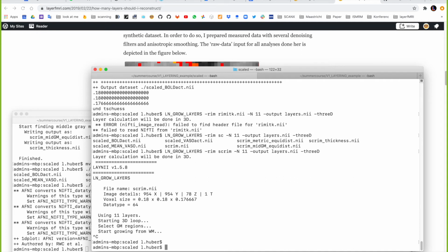And this is in fact very handy. Often when you draw it across the different slices, you don't really have the same borderline across the different slices. And as soon as you do it in 3D, it kind of averages out the slices in the third dimension. There's no reason not to do it in 3D. In fact, if you run the 3D flag, even if you have a 2D slice, it should give you the same thing. Okay, cool.